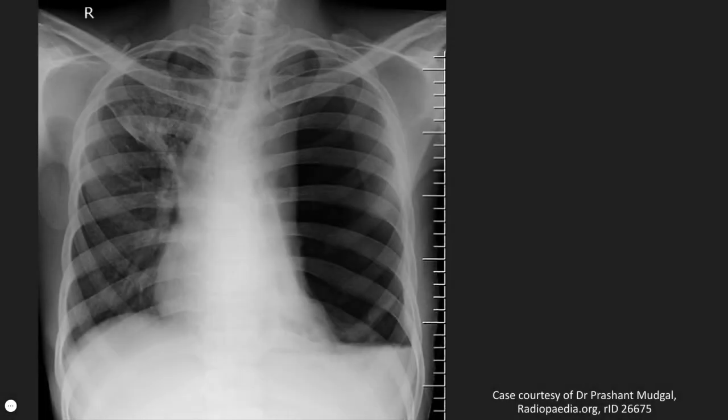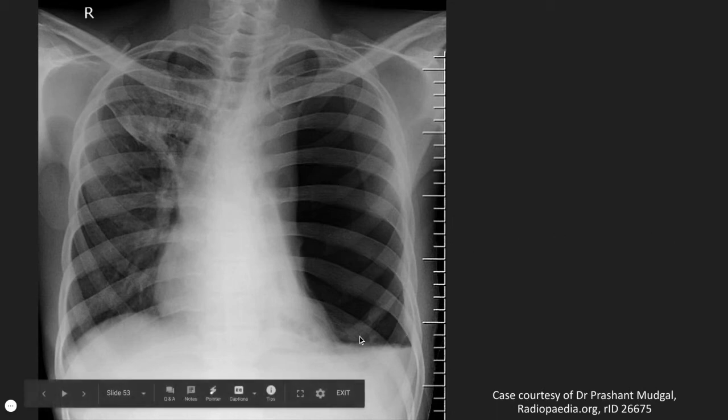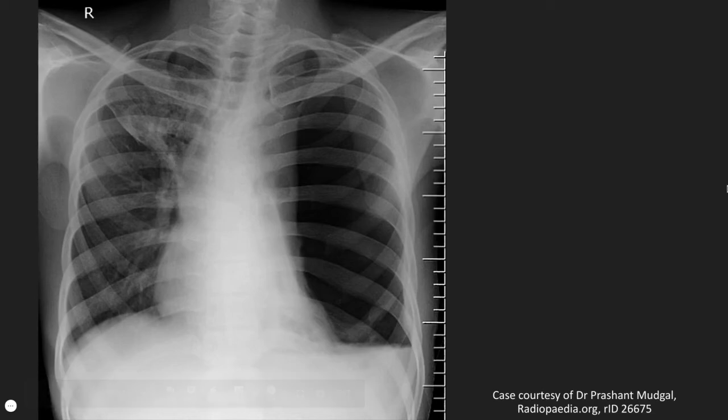This is a left-sided hydropneumothorax, so air and fluid within the left pleural space. When pleural fluid has a very straight line, it typically indicates an air-fluid interface. There is rightward mediastinal shift and also patchy right upper zone consolidation. Clearly in this example, it's obvious that there's air, but the straight line is a nice guide to an air-fluid interface in more subtle cases.